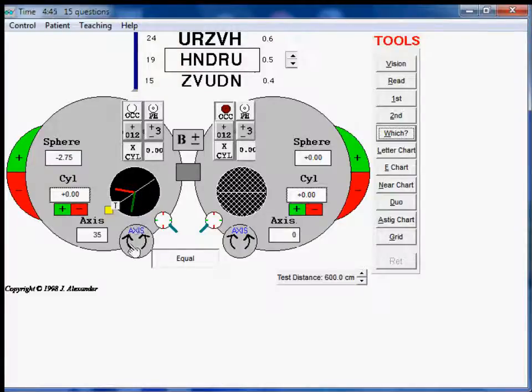Now, what we need to do is find the exact angle. And how we do that is we average out the two ranges. So we go to 33. And from 33 to 36, you realize that they're both equal. Maybe go 32. Between 32 and 36. Now, the intermediate between 32 and 36 is around 34. So we're going to choose 34 as the axis.